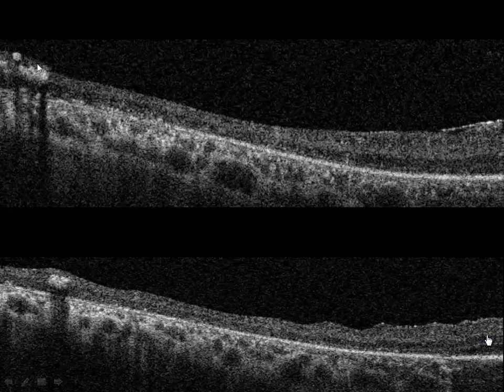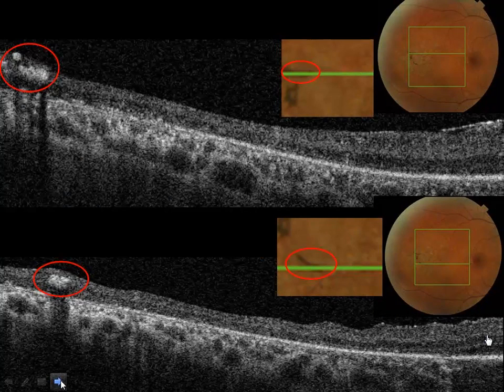This is a little bit further out. We're now seeing something a little bit unusual. What might that be? Turns out that's pigment, and pigment migrates in retinitis pigmentosa. We can show that because we can actually look at the TopCon image and compare it. So we're getting fundus photography done at the same time as OCT, and we can go back and forth between them. So right over here, higher mag, we can see some pigment. That's the slice we have.